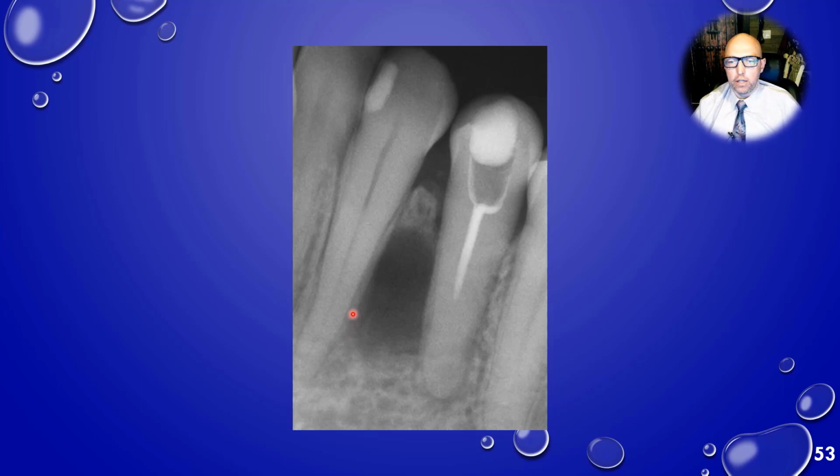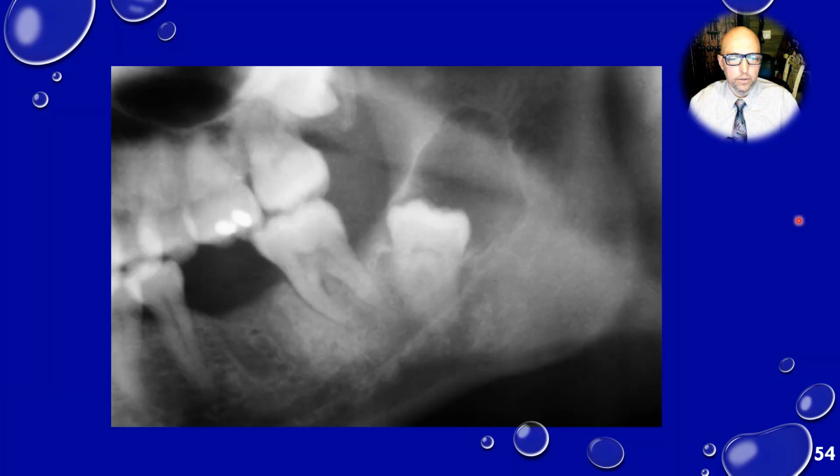So remember me mentioning globulomaxillary cyst? Typically the anterior maxilla, but you could have the same differential on the anterior mandible. This is just distal to the canine, but it's that same location. So lateral periodontal, OKC, or lateral radicular, and this one is an OKC. But nothing too distinguishing about that that's telling you that that one was an OKC.